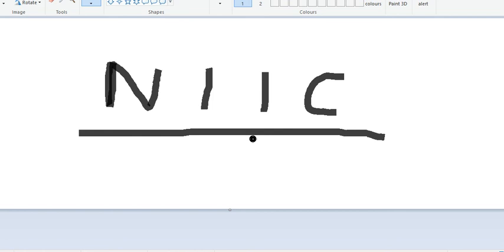This was just a simple overview, and in another video I'll be going through some more advanced image interpretation of the hand and fingers and put into practice what we've been discussing in this video.